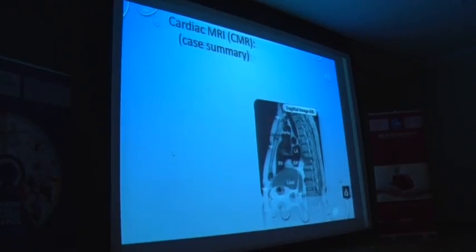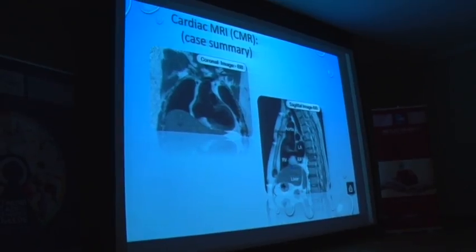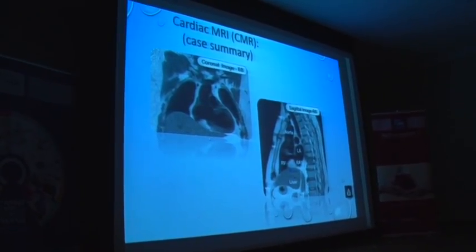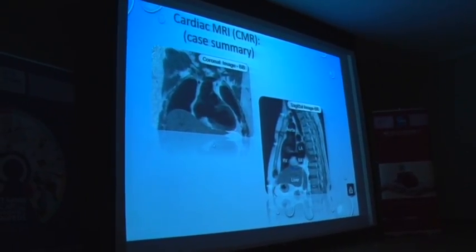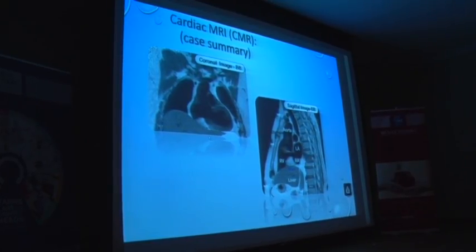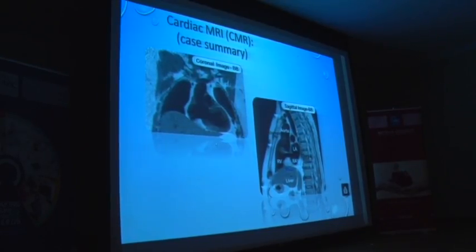So for the patient, we performed some black blood images, as you can see, in coronal and sagittal, and you can see here there is something abnormal. The question is, is it inside or outside? No, it is not a thrombus. No, it is not a myxoma. Take your time. Everyone wants the gift. Okay, so it is something white. Take care. Something white, and it is below the heart or inside of the heart. We don't know. Okay? We'll go for the next set of images.